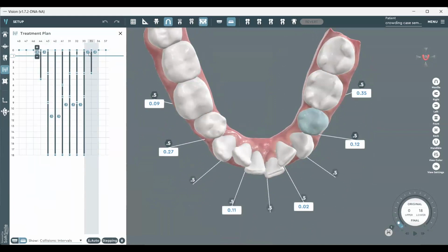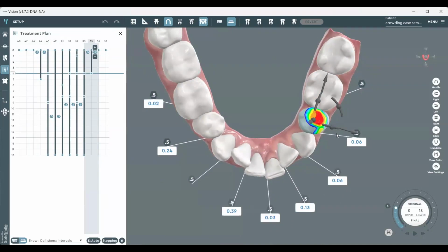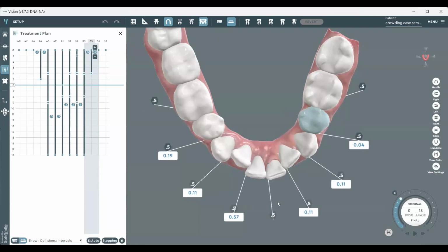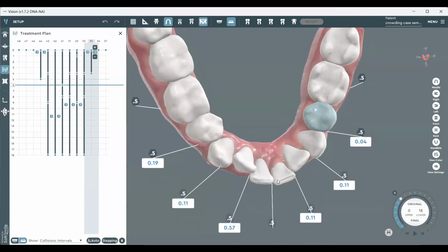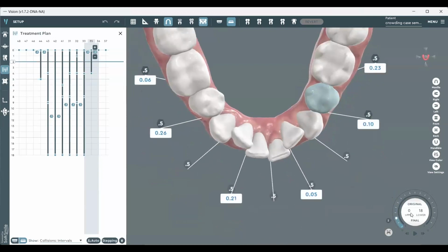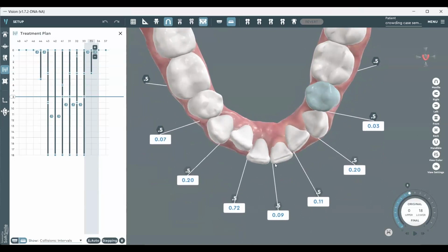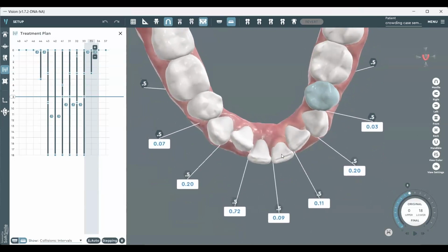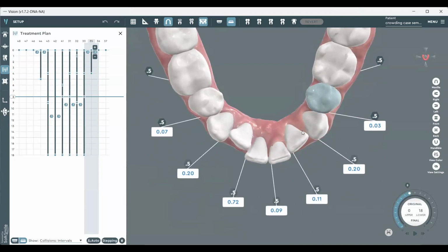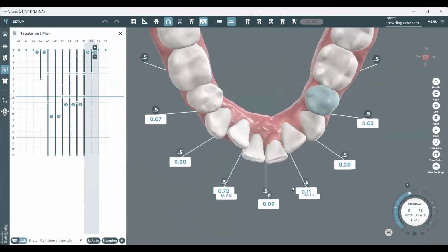Here you can see it is starting there. And to do expansion, we move these ones distally to make expansion. This is a protocol that we saw in the last treatment, a zero tolerance protocol. So we open the spaces around the teeth with expansion. And when we have a better alignment, like this here between centrals, canine and laterals, we open the spaces to make the IPR.